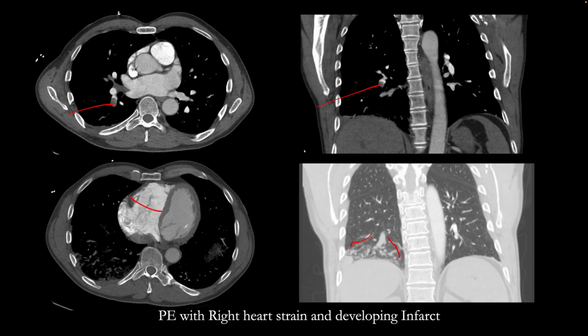And if you have AIDoc, then immediately the software program will flag the study and it will show you where the filling defects are identified in the pulmonary artery branches, making your job much easier.